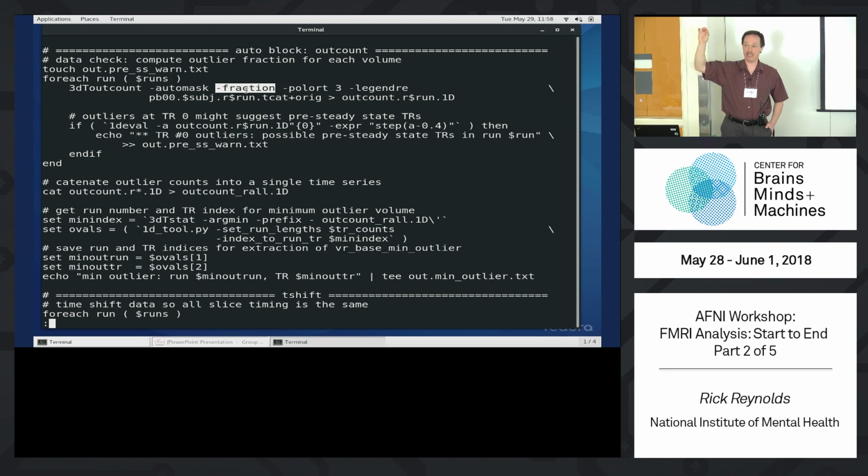So now, for each voxel at a time, you have a time series of whether or not it's an outlier. And to flip that around, at each time point, you know what fraction of the brain is considered to be an outlier. If a lot of the brain is an outlier, you probably have motion, or a scanner artifact, or something like that. In the golden or the tin days of years past, scanners had more problems. There were more artifacts that you had to worry about. This was looking for them.